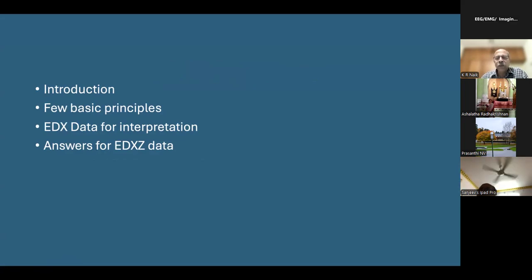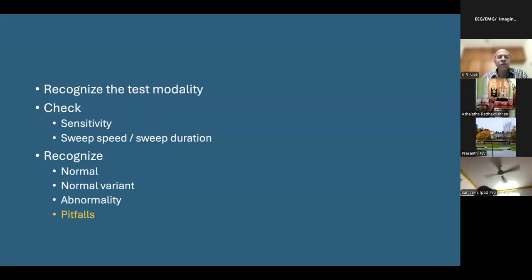I set around 20 graphs or videos for interpretation. This will be followed by answers for the previous data and explanations, and there may be additional graphs which I'm going to show for highlighting the abnormality or the phenomenon.